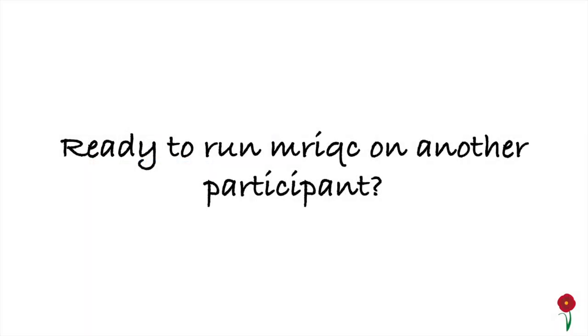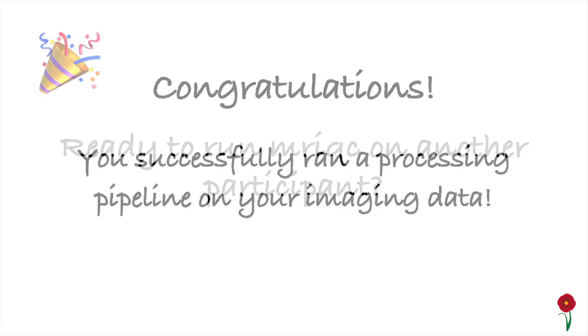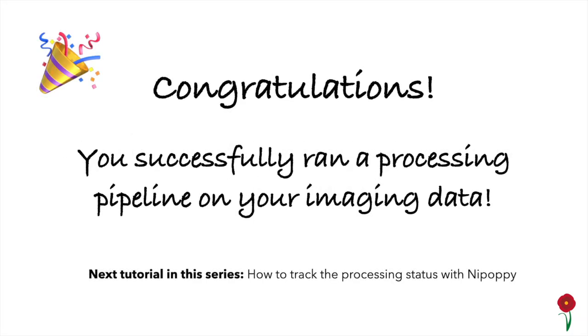Are you ready to run MRIQC on another participant now? Congratulations! You are now ready to track the processing status of your dataset.